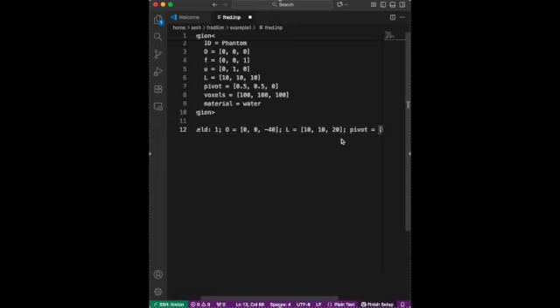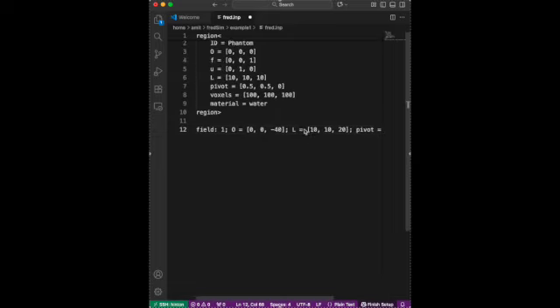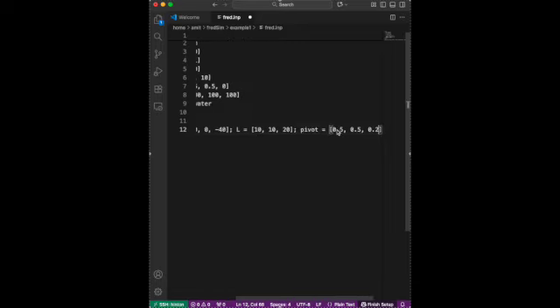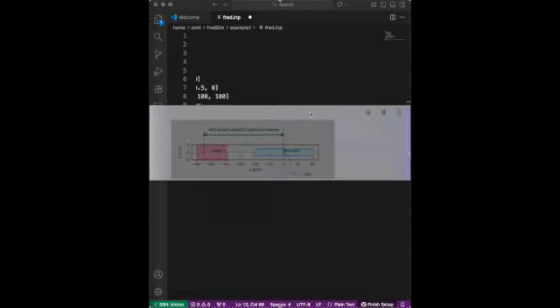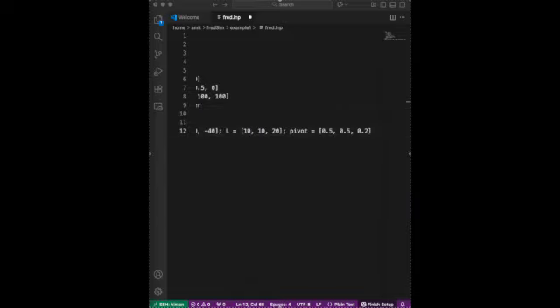So this pivot, now I have the field box from where the proton will emerge, and this pivot says that the beam emerges at the center. That one beam emerges from the center of the xy plane, which is 20% inside the beam box. And again, I think I showed you the picture. I'll show it to you again. Again, this is from, okay, let me show it with the website.